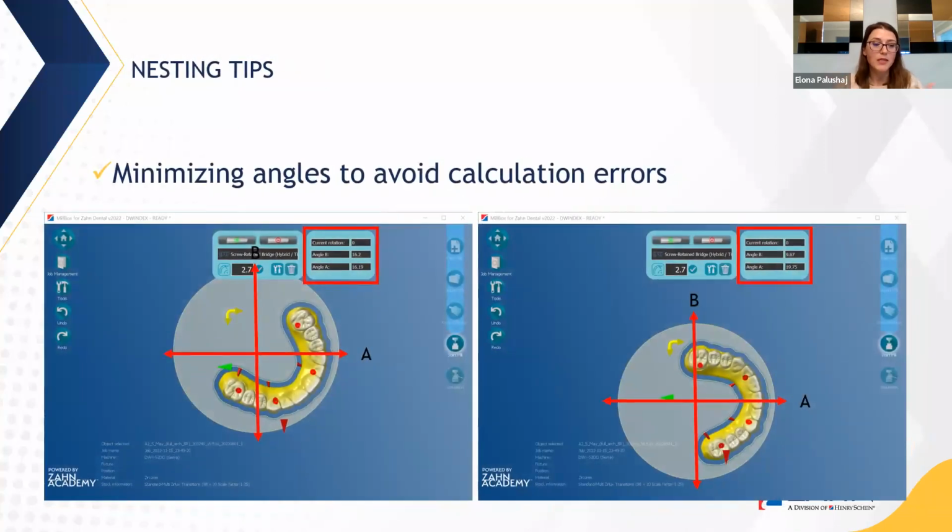So that's basically an overview of Strategy Editor. Of course, there's a lot more to it, a lot more that can be learned. Let us know if you need more in-depth training or if you have any further questions about it. But I just wanted to cover some of the most used things that you can do on a daily basis pretty easily. So we'll cover a few tips and tricks, and I'll try to keep it under 10 minutes.